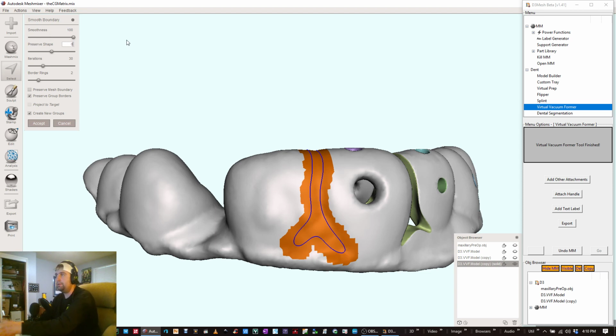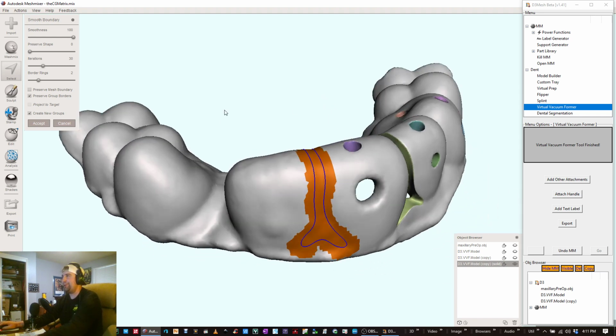And again, all this should be optimized, and that's why I created D3 mesh, and this stuff will be implemented down the road here. But this is just too good to not show you how to do this right now. It will be automated in the future, but this is the manual way to do it, and this is just a really, really cool thing. So that's that. We're at 0, 100, 0.